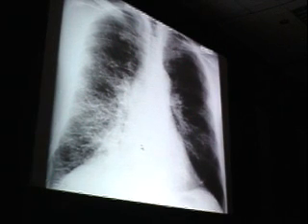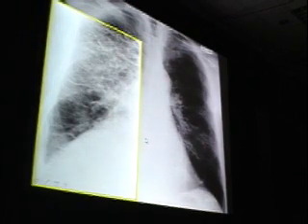And in my experience, if you see unilateral interstitial lung disease, you can virtually make a diagnosis of lymphangitic spread of tumor, adenocarcinoma. What you'll see, it usually works out in these cases, they normally can't really find the primary. I tend to believe most often it's going to be a lung, and it's more common on the right. What really happens is the lymph nodes get obstructed centrally by a central adenocarcinoma, and it creates congestion in the lymphatics on one side, which thickens all the interlobular septa. See it again, they almost always have very prominent septal lines and small pleural effusions, as shown in this case. But again, adenocarcinoma, lymphangitic spread, likely primary lung.